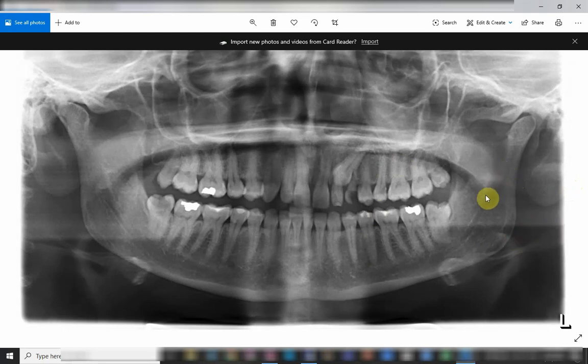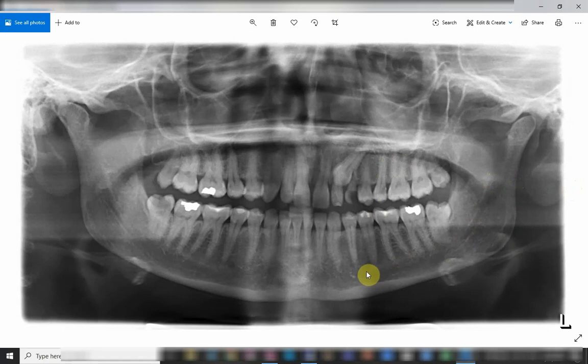In this radiograph you see that this is the canal, and then it goes again and it opens mesial to the lower 5. Again, it's almost identical from this side, where it can open mesial to the apex of the lower 5 as well. Here you can see that the opening is very close to the apex. Sometimes you will see it well below the apex, and sometimes it goes up.